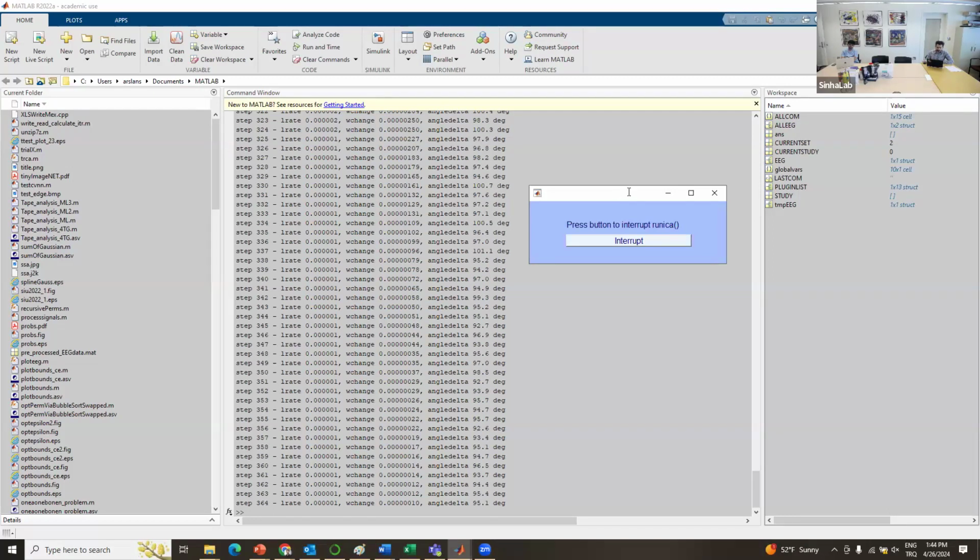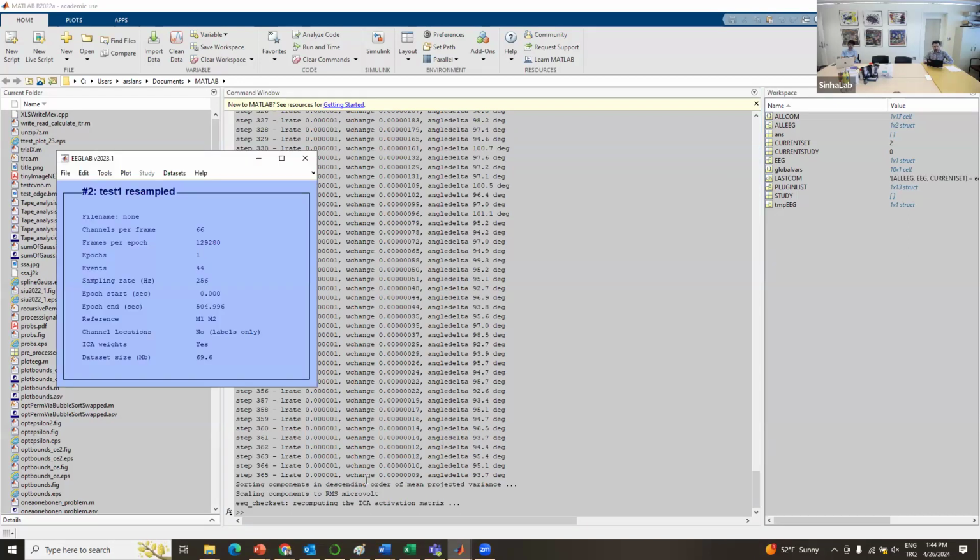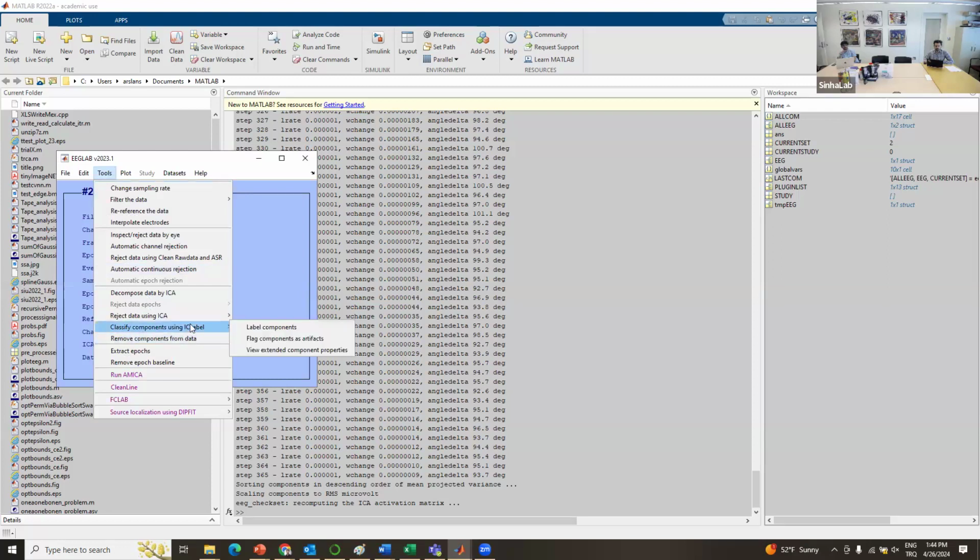Yes, very close. As you can see, there's a threshold, and this change here is close to 0. Actually, this was the threshold I'm using, and therefore, if it's less than that, it stops. So now we're done. Let me quickly show you the decomposition result.